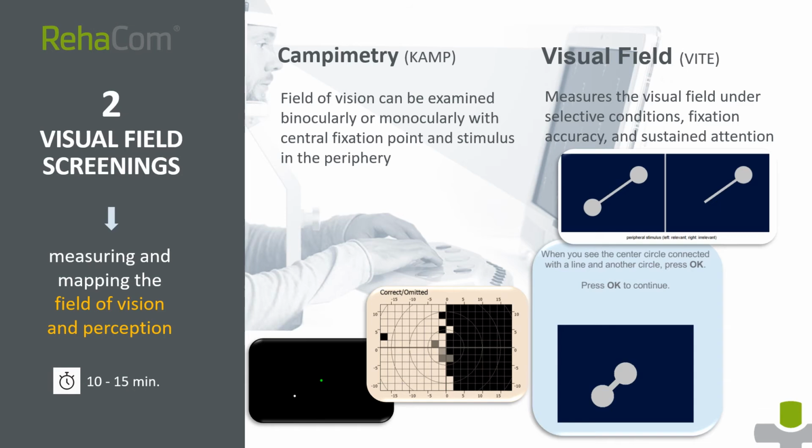In the results screen, you will have a scoring and a visual field mapping. Both screenings allow an imaging of visual field deficits, neglect symptoms, and reading disorders that is sufficiently precise for therapeutic indications. The visual screeners can be completed by a trained non-vision specialist clinician, but it does not substitute for a full evaluation by a vision specialist, an ophthalmologist or neuro-ophthalmologist.